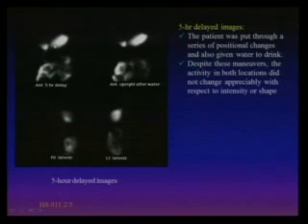2 locations. At that time, we didn't have a SPECT CT, so you can turn the patient to a different position and see if it changes, or let the patient drink something. Without the gallbladder, what do we give? No, we want to say that it's in the GI tract. If you let them drink, you wash it out, and if it still stays there, then you confirm that it's not in the GI tract.